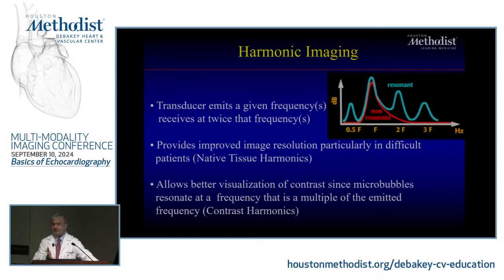Part of this depiction and discovery is playing around with contrast. Actually, this was developed for contrast. And why? Because these tiny microbubbles are very sensitive to being hit by a certain frequency, by a wavelet. So they resonate. And when they resonate, they emit a second frequency, third frequency.